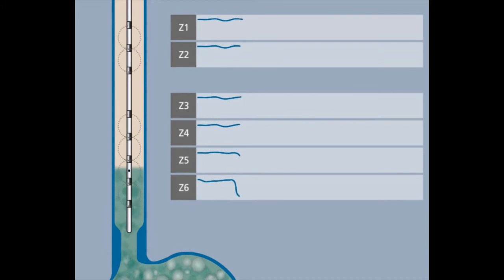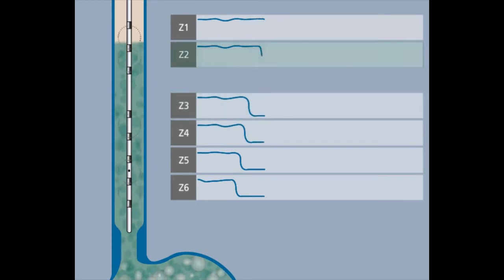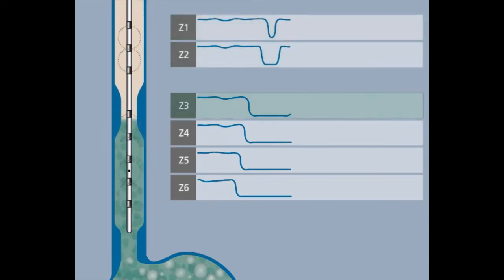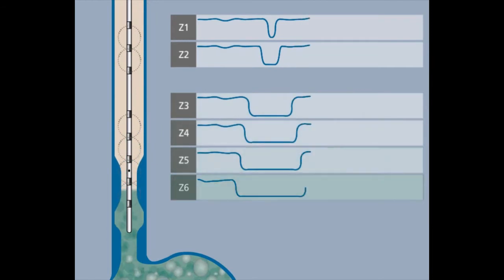As the refluxed bolus of gastric contents is moving farther up, channel 5 is reached, and the impedance level of that channel also drops. This continues until the reflux bolus reaches its highest proximal extent. This example shows the proximal extent up to the top impedance channel. On every channel, the impedance dropped, indicating refluxed bolus. The refluxed contents are removed from the esophagus by a peristaltic contraction. This is called clearance.